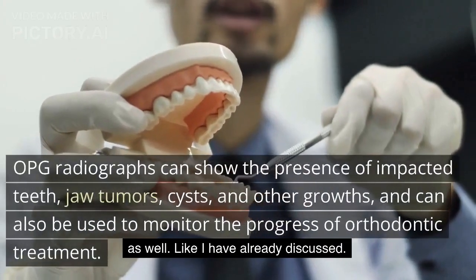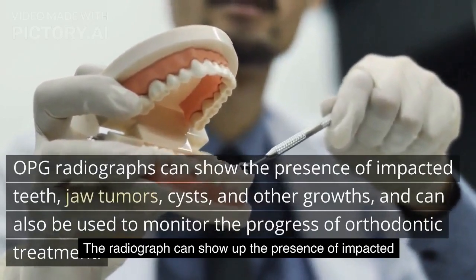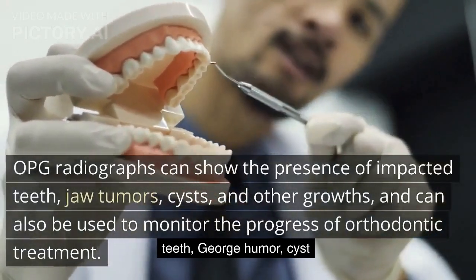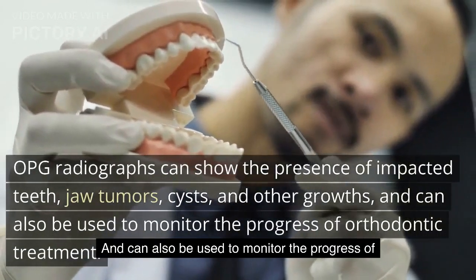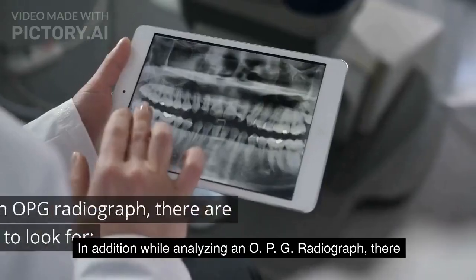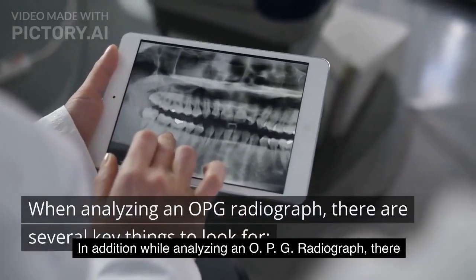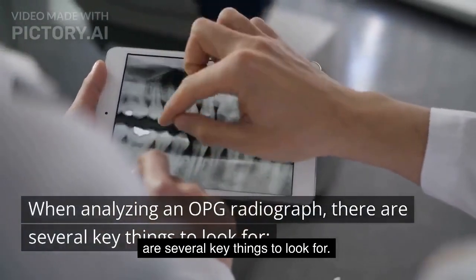Like I have already discussed, an OPG radiograph can show the presence of impacted teeth, jaw tumors, cysts and other growths like granuloma, and can also be used to monitor the progress of orthodontic treatment as well. In addition, while analyzing an OPG radiograph, there are several key things to look for.